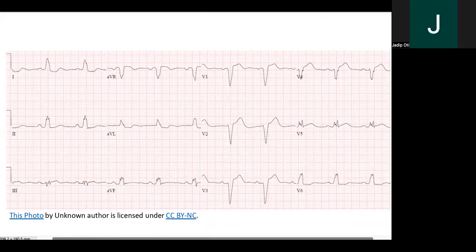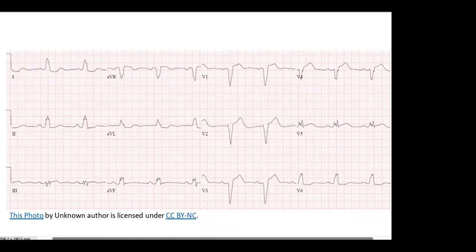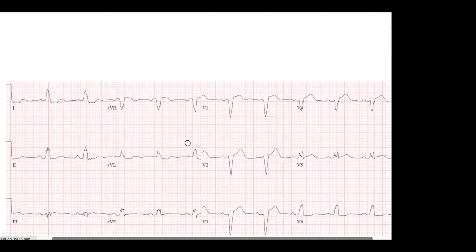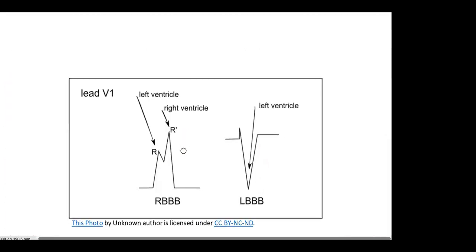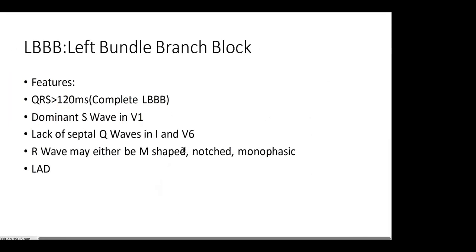We go back again, and again, until we get to the left bundle branch block. So, left bundle branch block. This is going to be very important.